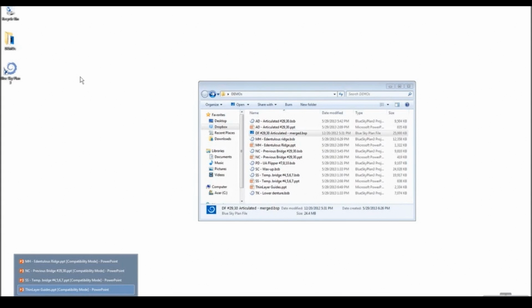Then we use little 3 millimeter or so pieces of number 50 gutta percha, and you place 3 on a side and 1 in the midline, spaced out relatively evenly on the scan appliance. The key thing is that the gutta percha has to be placed as deep in the vestibule as possible because of the scatter from any metal in the teeth.